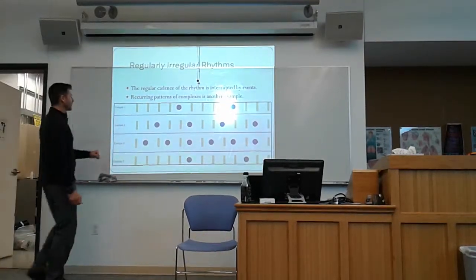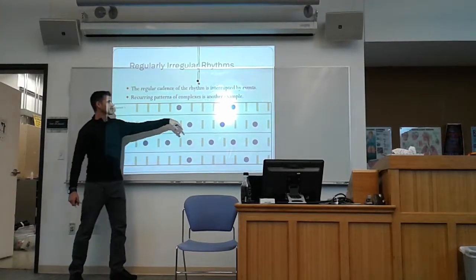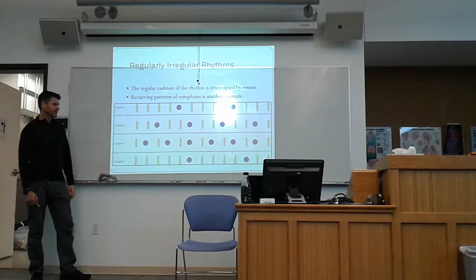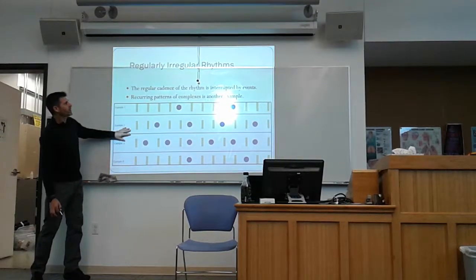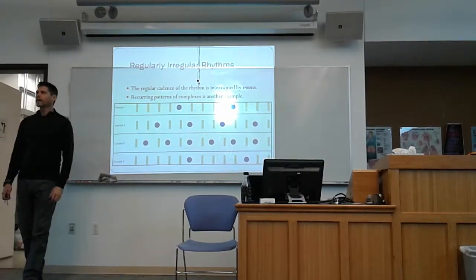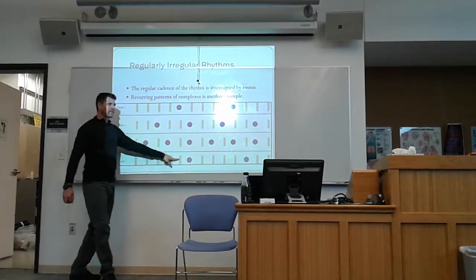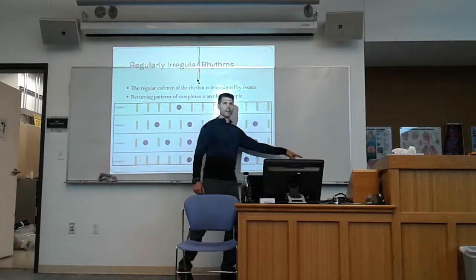In this one we have 2 and something weird, 2 and something weird, 2 and a drop, 2 and a drop, 2 and a drop. Here's a 1-to-1 relationship, right? All of those would tell me that there is some sort of regular pattern to it. Maybe I have a 5 and a drop, 4 and a drop, 3 and a drop.